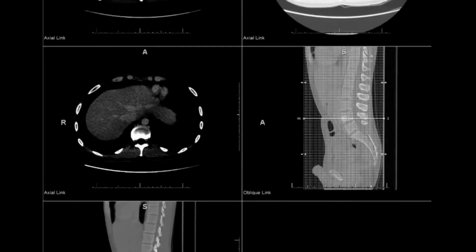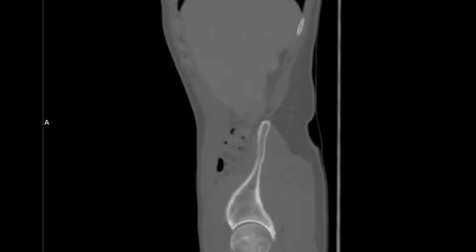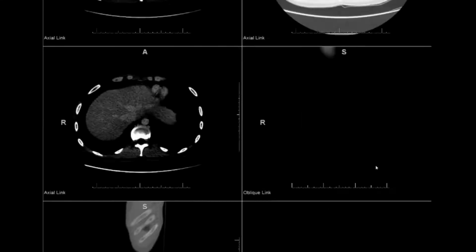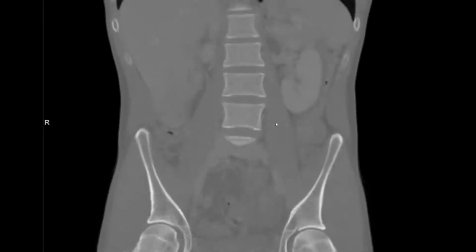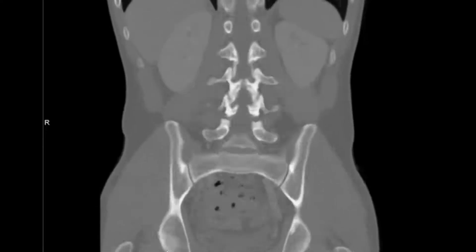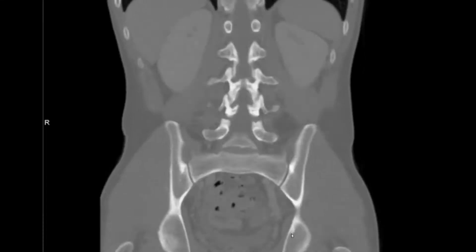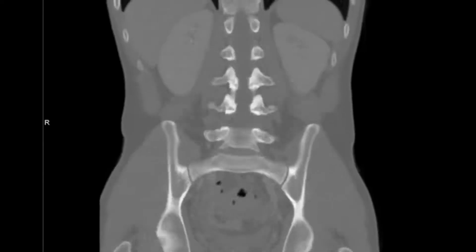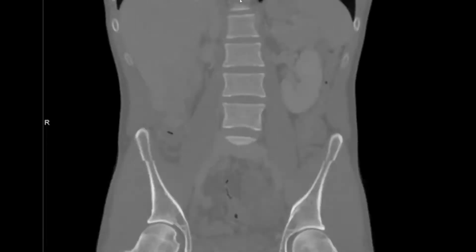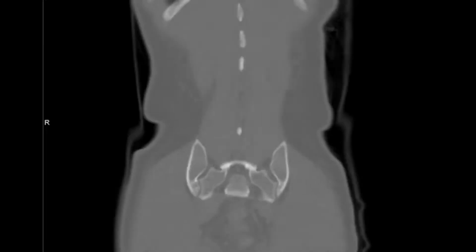And then looking at bones, again, coronal and sagittal are your best friend, a nice straight view of these ribs. And we have a nice little bone island there. If I put a ROI on it, I'm sure it's over 1,000. This is kind of indeterminate, but I wouldn't even mention it just because we see them a lot. The same with that, another bone island, it appears. Vertebrae, again, are more common for metastatic sites, I think just based on surface area alone. Nice straight view of the ribs, so nothing's there.